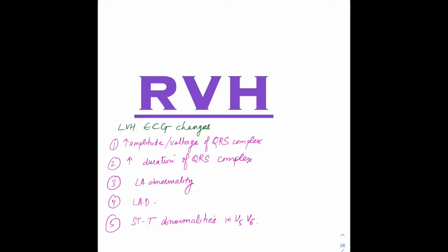Okay, so in this video, we will be covering the ECG changes in case of right ventricular hypertrophy. Before that, I would just like to spend a moment and revise the ECG changes that we will be seeing in case of left ventricular hypertrophy.